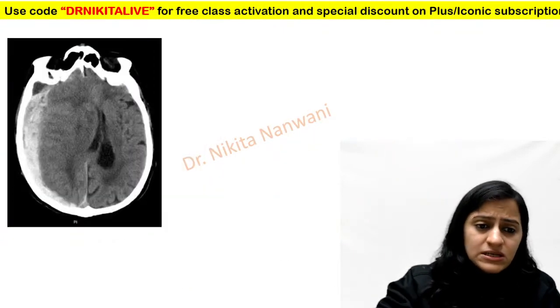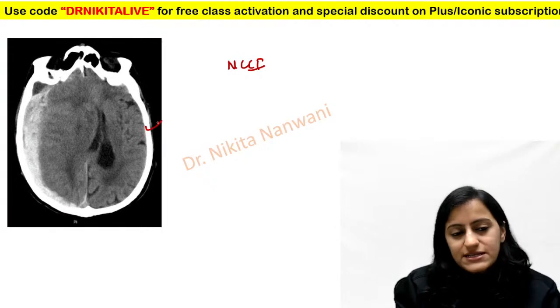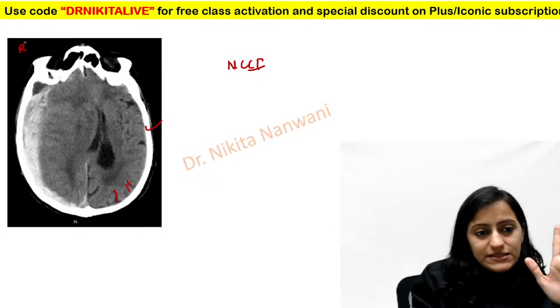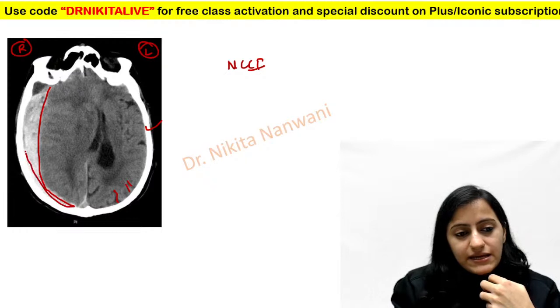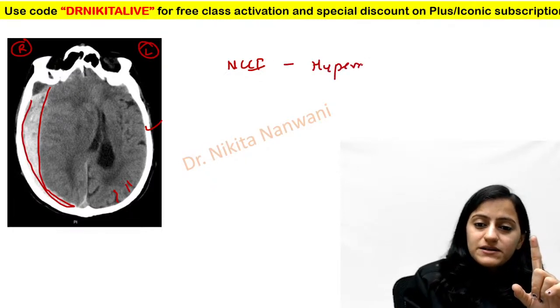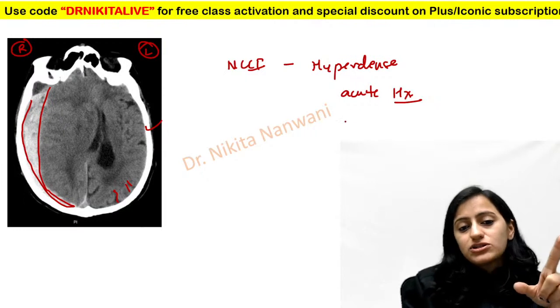Okay. Look at this one. What do we see here? Again, this is a CT scan, a non-contrast CT, the white bone. You do not see the white blood vessels. This is the right side. This is the left side. And we see a pathology here, which is hyperdense, white on non-contrast CT. It is acute hemorrhage, right? Always remember, it is acute hemorrhage. It is on the right side.